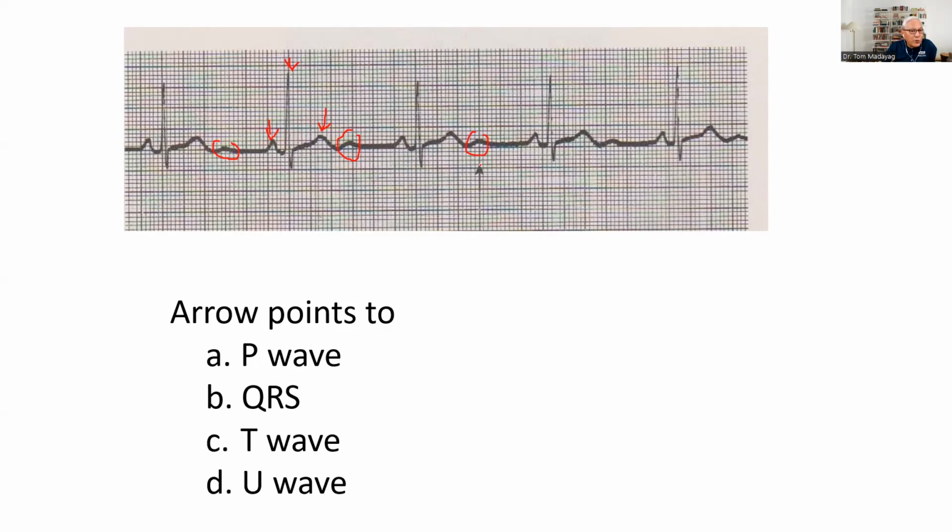Just as a review, a U wave may be normal or it could be abnormal. It becomes significant only if it measures 2 millimeters or more, and if that is the case, then this is a manifestation of hypokalemia. So if you see this on the monitor, you need to correlate the finding by checking the serum electrolytes, in particular, to determine if the potassium level is abnormal.